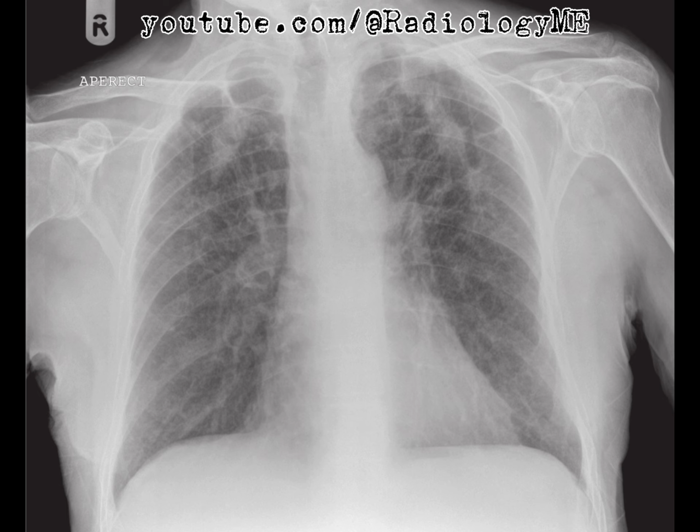If this were my patient, I definitely want to review any previous imaging to assess for change and to determine if we need to escalate to further imaging, like a CT scan, if the picture isn't clear. To sum up, these findings most likely represent silicosis with progressive massive fibrosis. We should also consider the possibility of tuberculosis, given the risk factors, and it's crucial to keep an eye out for any coexisting malignancies. Given the patient's history, a respiratory referral is a good idea if it hasn't already been made. And that wraps it up.